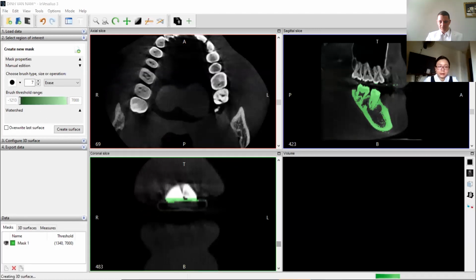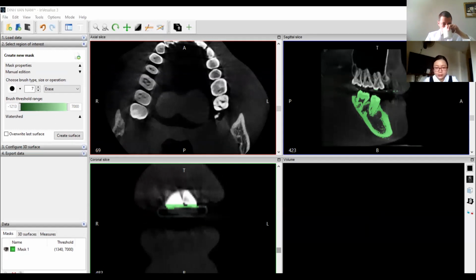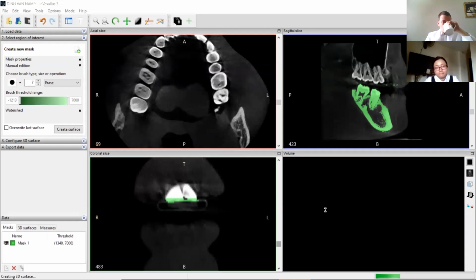You see the progression here. Mình sẽ thấy được cái tốc độ thực hiện của nó ở trong cái thanh công cụ ở phía dưới ở bên phải. Can take some time depending on the computer because in fact it uses a lot of computing power for doing this. Thì tùy vào cái máy tính và nó thường sẽ tốn một ít thời gian, tại vì để làm được cái này thì mình sẽ cần cái máy tính nó chạy.